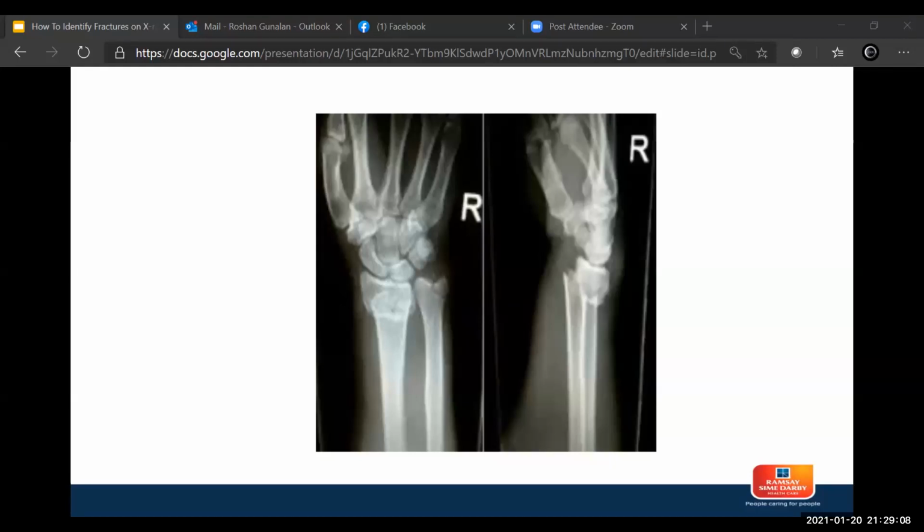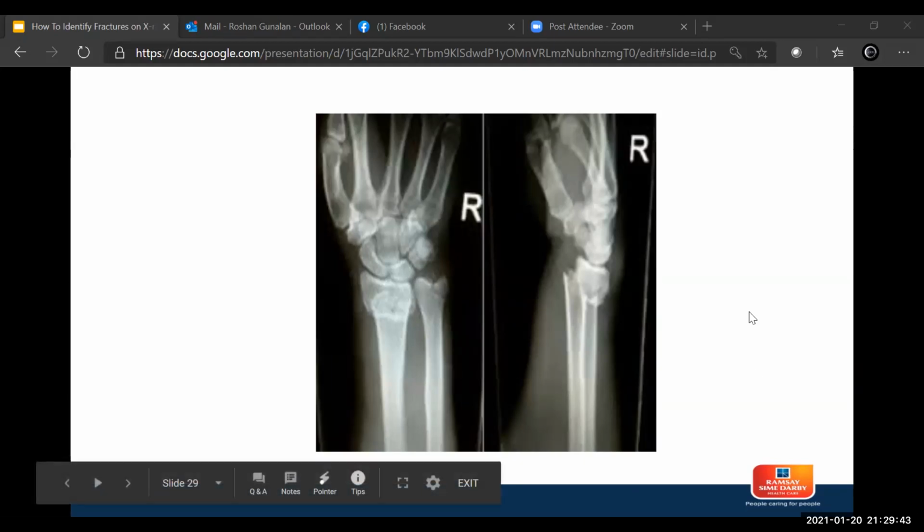That's a diagnosis though. So when you read the X-ray, you cannot come up to me and say, "Oh, I got a Colles fracture." It makes no sense. So you have to go step by step and practice describing the fracture. The diagnosis is correct, it is a Colles fracture, but that's not what most people want to hear immediately. Especially if you're training for masters, you should learn how to describe it. It's very important. Always make a description in your mind before you read the X-ray report. You may have got it right, it's Colles and whatnot. That's fine. But you're going to get no marks for just saying Colles fracture. You get the marks by describing it more. That's just to practice, and I'm sure most of you will see a lot of X-rays on a daily basis anyway.